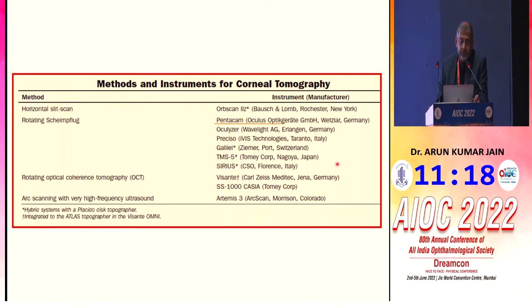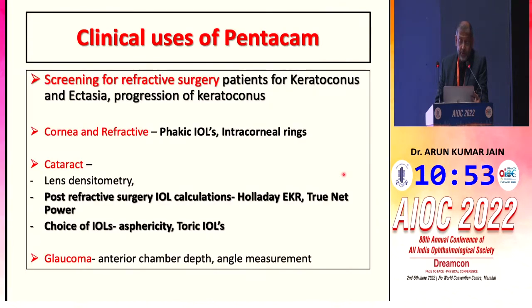As we all know, there are a lot of instruments available which can give us corneal topography. Many of them are slit scanning and elevation based tomography. We have the rotating Scheimpflug principle, and in that we have again a series of instruments, but I'll be giving my talk based on Pentacam only.